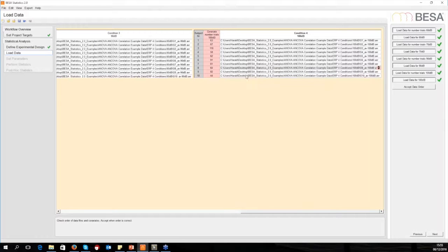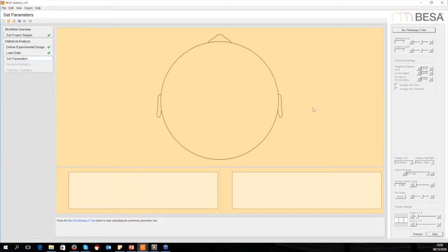So this is important for the right covariate to be factored into the equation with the correct response, but also if I do my permutation testing, permutation shuffling, I want to make sure that I shuffle the conditions between the correct subjects. Okay, then go next.